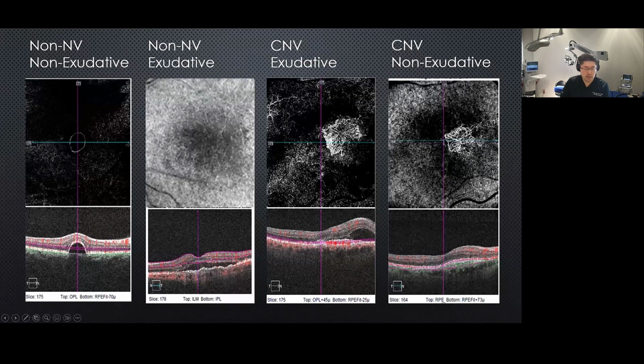So despite repeated injections, you may or may not resolve the subretinal fluid. In fact, based on the fluid study, sometimes subretinal fluid is healthy, just like in central serous chorioretinopathy, or CSR. Fluid might be protective for these cases. If you are too aggressive, it can lead to atrophy and collapse of the residuals of the RPE layer there.